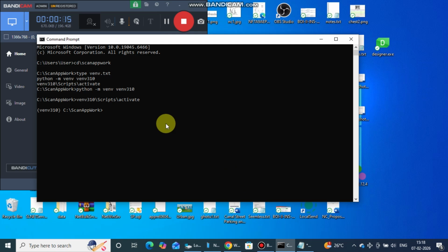Now here's a small Python-based app I developed that can give a score to 18 common chest diseases, not including tuberculosis. For tuberculosis I'll be working on a separate data set, and if a trained model is available, I'll use that. Otherwise I'll have to train the model.